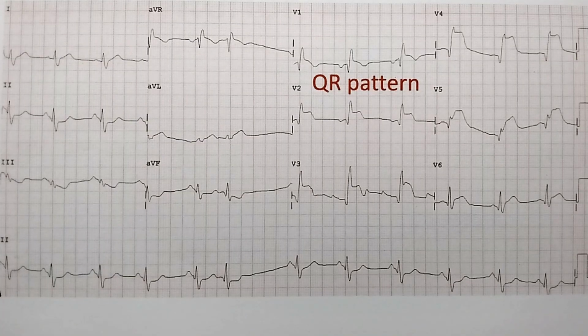So even though atrial arrhythmias may be considered less dangerous, in the setting of acute myocardial infarction, they are more significant. Atrial arrhythmias indicate atrial dilatation, left atrial dilatation, as we have already seen here. Left atrial dilatation occurs due to left ventricular dysfunction. So presence of atrial arrhythmia should warn you that the person is going for left ventricular dysfunction, and you may even anticipate acute pulmonary edema or heart failure.